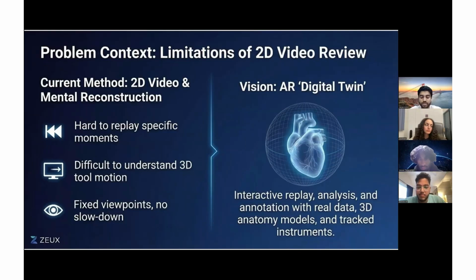Our long-term vision is an AR digital twin of the surgery that you can replay, analyze, and also annotate. But for Sprint 1, the goal was deliberately small: prove we can create a working AR playback slate, something that plays back a procedure, lets you scrub through time, and shows how an instrument moves relative to a target. Now Bashar will explain what we accomplished in Sprint 1 and how the video logic works.